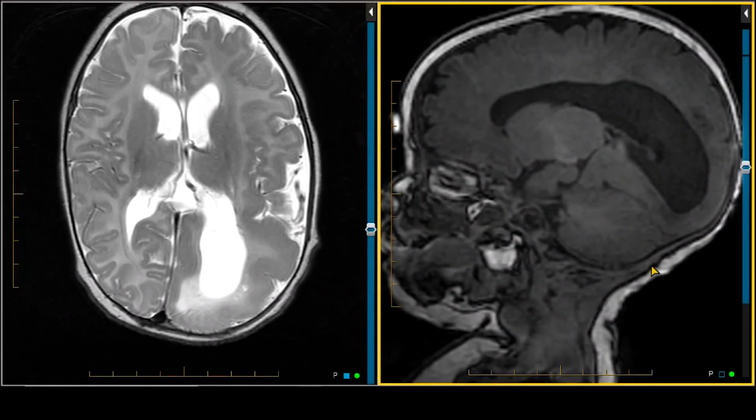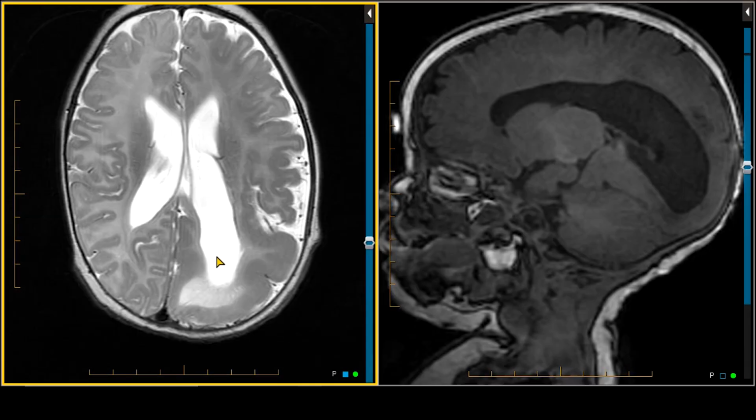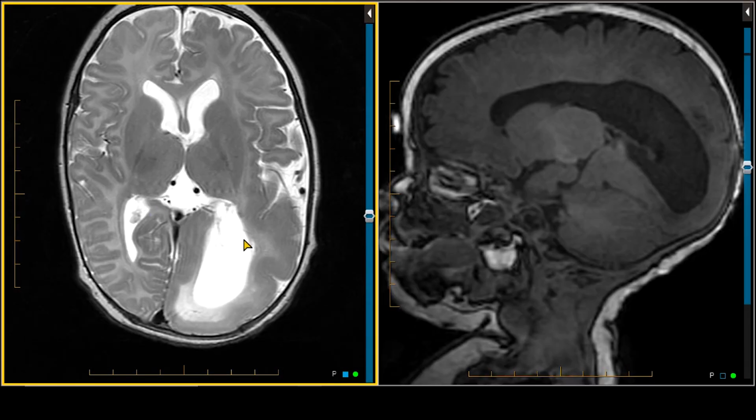This is an MRI scan of the brain in a 2.5-month-old child with severe seizures, predominantly affecting the right side of the body. Immediately we see several abnormalities. First of all, we see an asymmetry in the size of the hemicranium. We can see here the left hemicranium is larger than the right. The left cerebral hemisphere looks larger than the right. The left lateral ventricle, especially posteriorly, looks larger than the right.